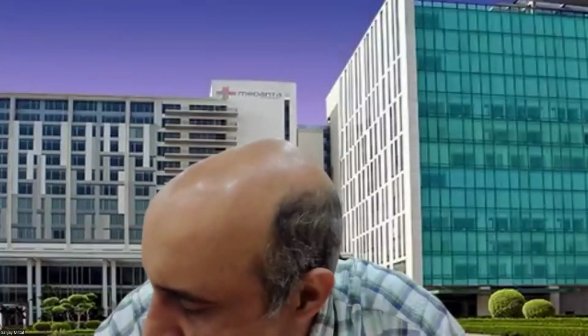That's an excellent question. There would be times when even Dr. Rakesh Gupta and I can falter, but I give you certain tips. Point number one is that the 20% to 50% assessment is all theoretical. You are not going to measure the thickness of each segment in diastole and systole. The practical tip is, when you are watching the segment change in diastole and systole, you can see whether perceptible thickening is still there.